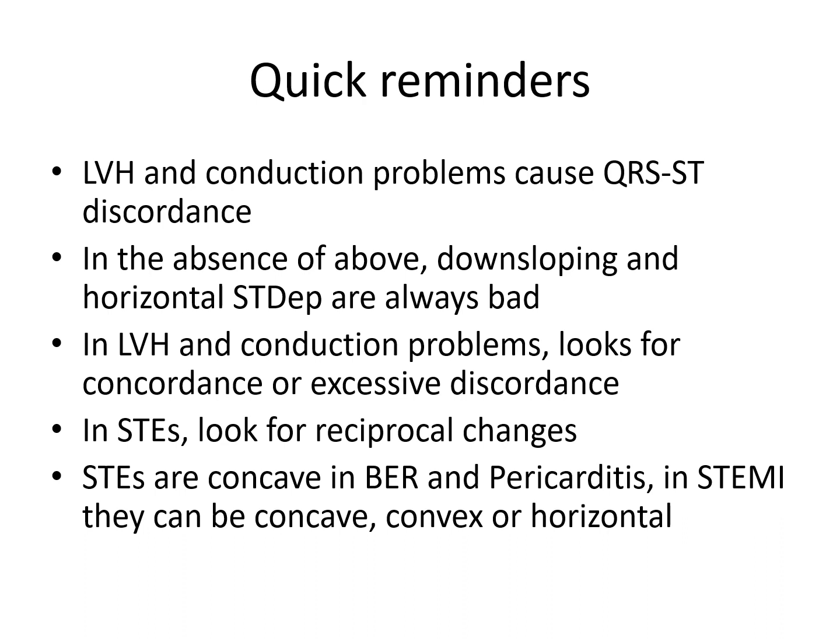In ST elevations, look for reciprocal changes to help you define the territory. And if you do see concave ST elevations, it is more likely to be benign early repolarization or pericarditis. If you see convex or horizontal, that is more likely to be a STEMI.